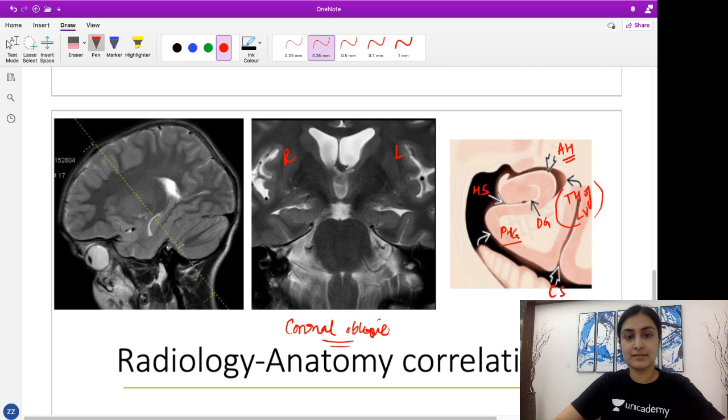So you have this right hippocampus and the left hippocampus. The white area that you see here is nothing but what? It's the temporal horn of the lateral ventricle, correct, that we saw here. And remember, these interdigitations are normally seen. These undulations or lobulations should normally be seen. A loss of these interdigitations is also one of the features that occurs early on in the stages of hippocampal sclerosis. So this is what a normal hippocampus should look like.